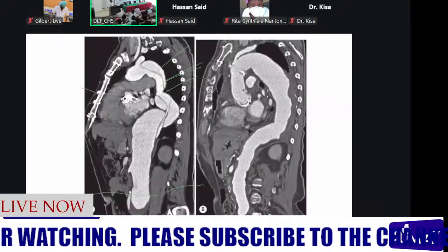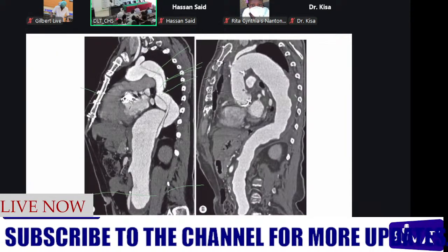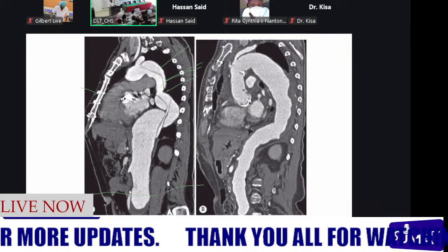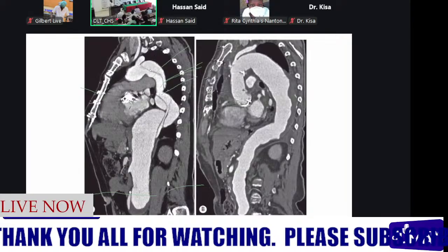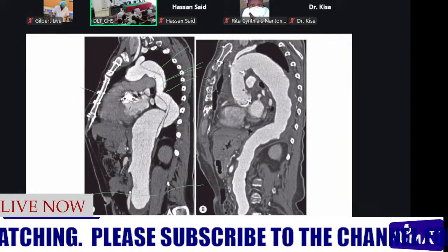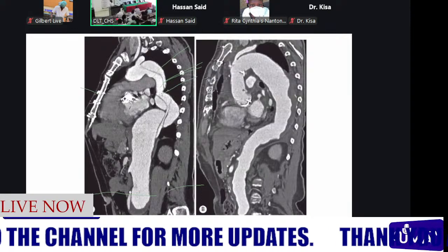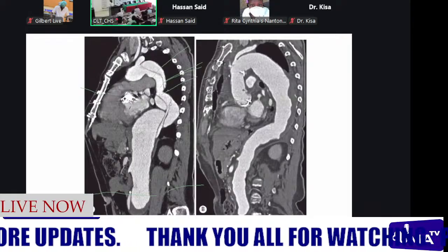Then the other thing that we can also use to differentiate, still here we have aortic dissection on my left, then a thrombosed aneurysm on my right. So the other thing that we can look at for a dissection, it goes on spiraling around the true lumen. So here we see the dissection and the intimal flap is present. Then we have the true lumen, and our false lumen keeps changing position as it goes down, like it winds around the true lumen. So we see it at this position, then it comes in front, then again it's posterior, then anterior. So that is how it keeps moving.